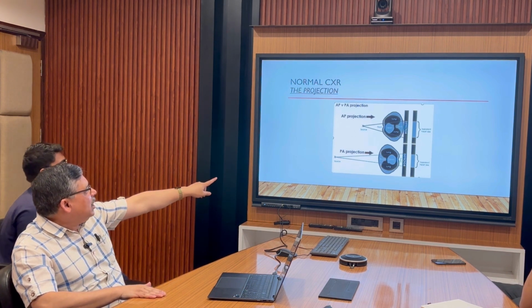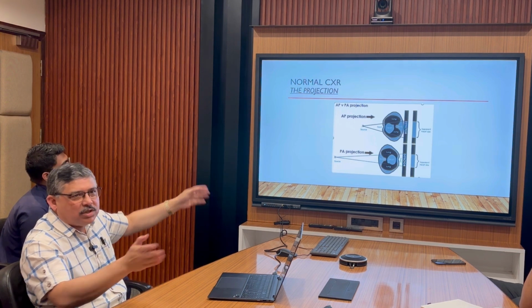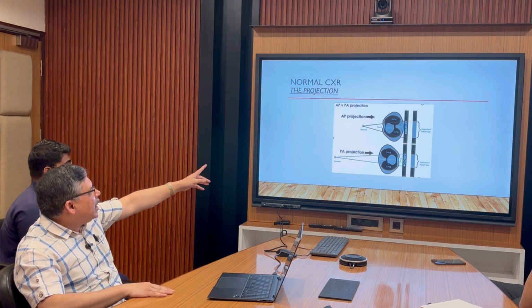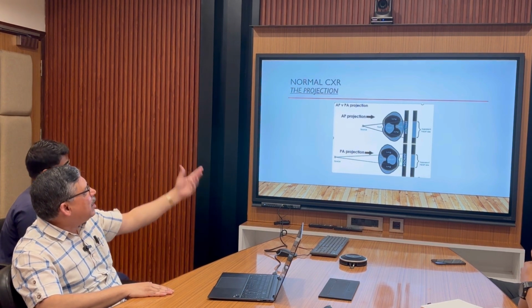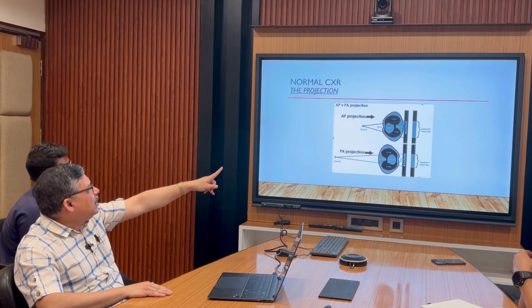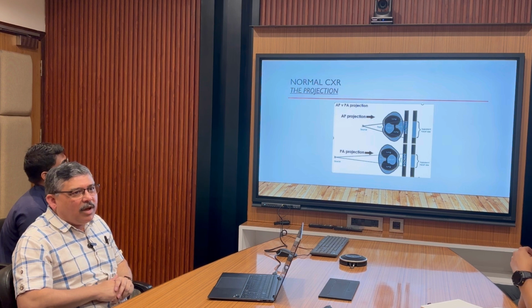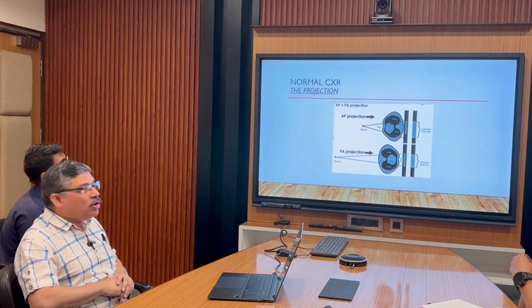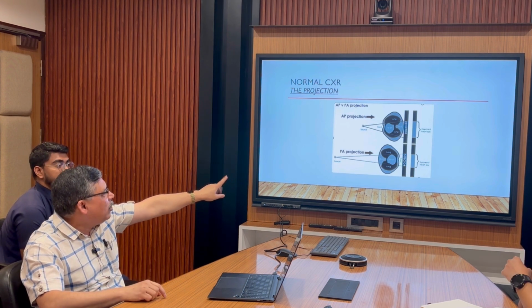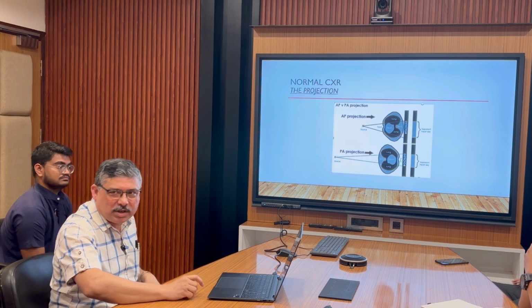So you see, if I change that to an AP view, you don't know where the source is. It will be much nearer than in a PA view. And see what happens when you turn the patient around and face the source. You will see the apparent heart size will be bigger. This is what happens with the heart. So you do not comment on the heart size except on a PA view. Okay? Understood? This projection was good.